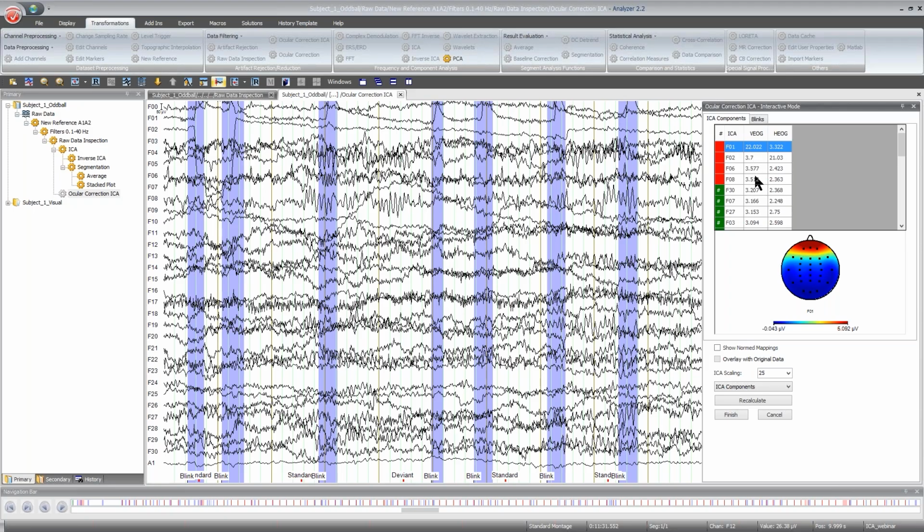And only when you add these 3 others, or maybe also fewer because this is marked for both of them together, you reach the 30. And this is why more is marked in here. And the same is here with the HEOG. So there's the first one, which looks very prototypical for our HEOG activity. However, it's just a score of 21, so something has to be added.